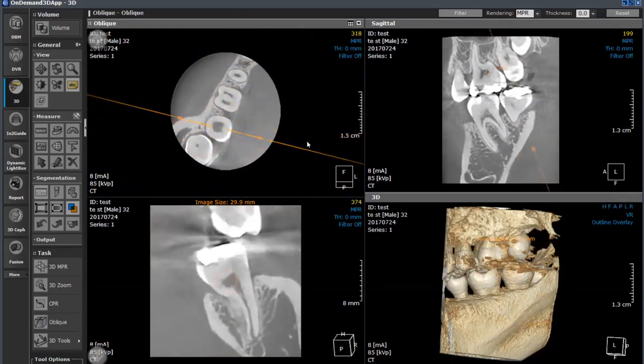Now, a lot of these images are not with our new MAR. We have a precision MAR out that helps to reduce some of the metal artifact. So you can see here that even with these fillings you're getting a little refraction, but with our precision MAR, we actually get a much clearer view now. And you can actually evaluate right next to things like braces and implants, because you don't get that shadowing any further.